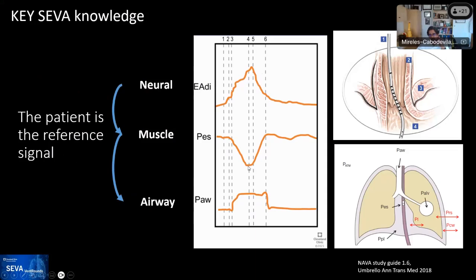And so even though there is activity and the brain is asking for more, and this is a subtle example, there are more marked examples in which the pressure may not change further based on the electrical activity, and that could be because of neuromuscular weakness or physical limitations of the lung reaching total lung capacity and whatnot. So those things can occur.